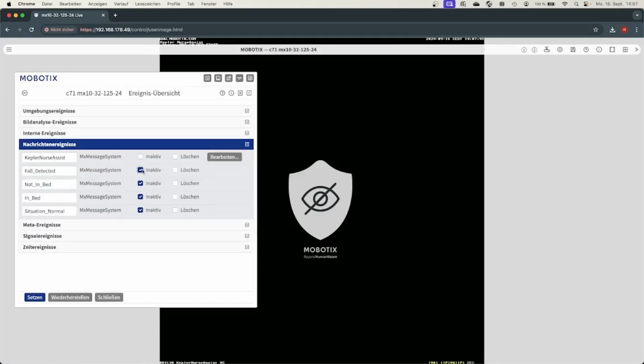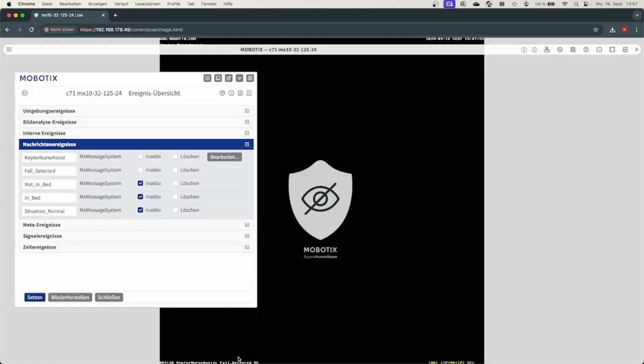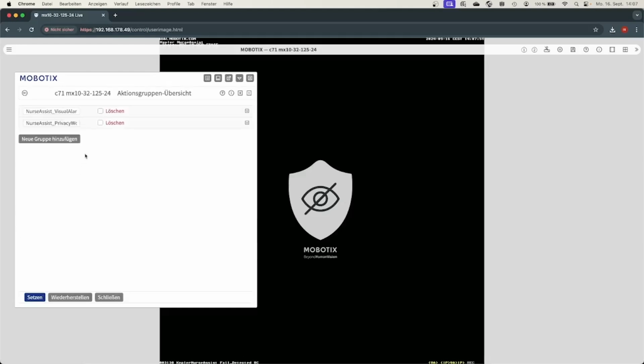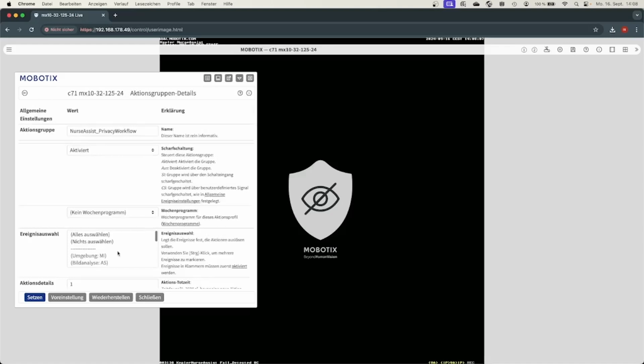If we now say let us enable, for example, fall detected in addition, then you also see in the live image below, in the image itself, that the fall detected event will be showing up. And then we switch to the action group overview, and there we also have two predefined profiles. One of them is called privacy workflow. In the privacy workflow, by default all events which the Kepler can detect are selected.